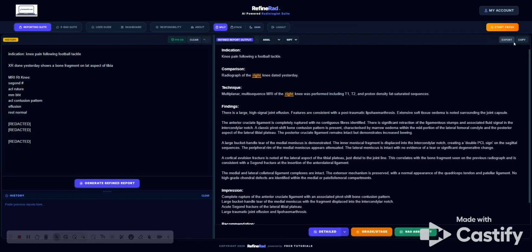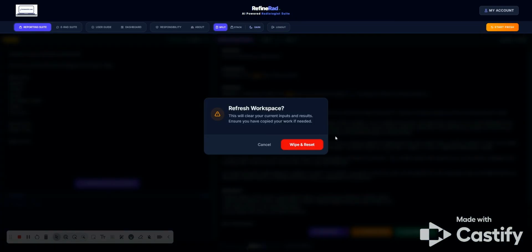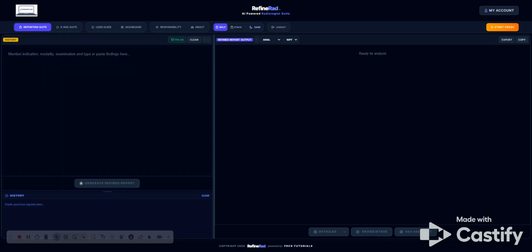So let me exit the chat model, and to go to the next case, you just click start fresh, clean, wipe and reset, and the slate is clean.